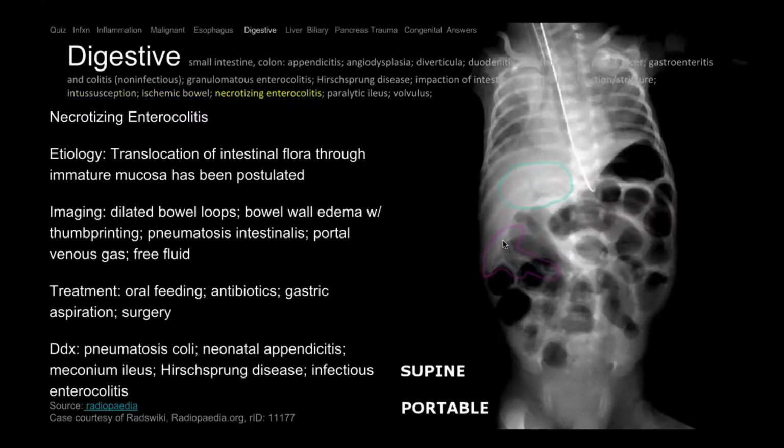Here's a similar dead bowel appearance in children. That's called necrotizing enterocolitis. They get air in the wall of the bowel, like you can sort of see here, maybe these little, it looks kind of dirty here, in contrast to the clean wall here. So that's called necrotizing enterocolitis. It happens in premature children, and the air tracks into the portal venous system. It's sort of hard to see, but there's this linear lucency, that's necrotizing enterocolitis. Okay.